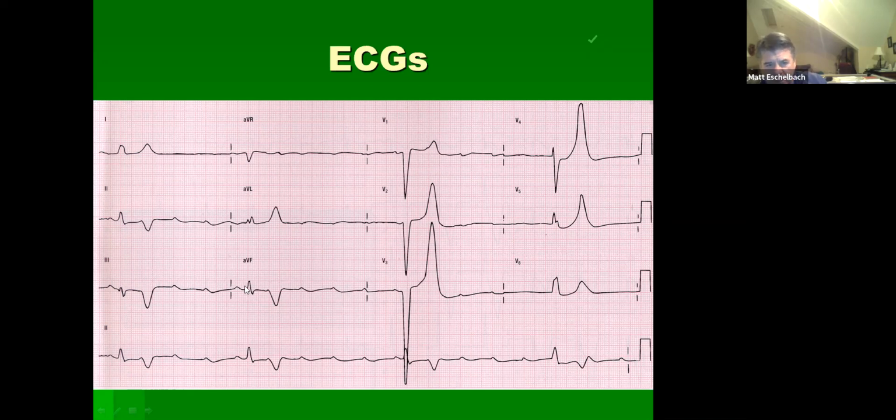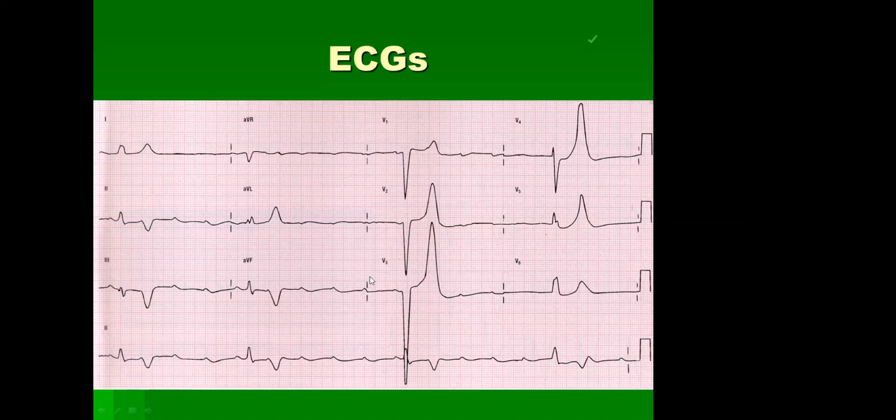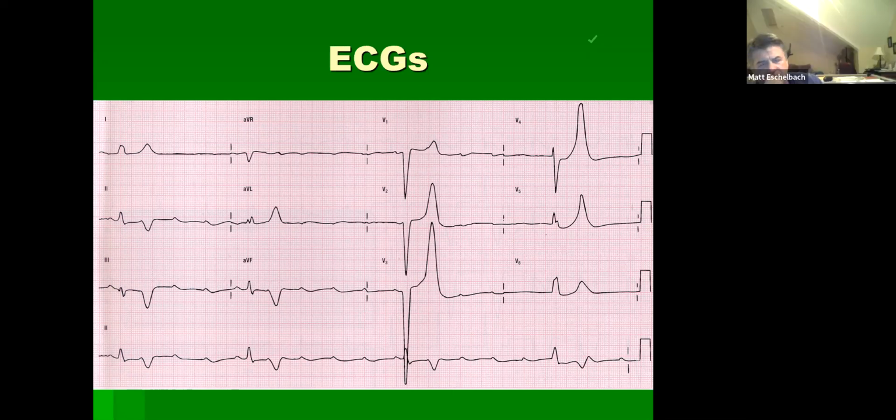So here you've got a beat, and then you've got a P wave and a P wave and a P wave. And finally, what happens to the ventricle? What do you think this is right here? Left ventricular. No, it's not a hypertrophy, but you use the word ventricular. It's a ventricular escape rhythm.